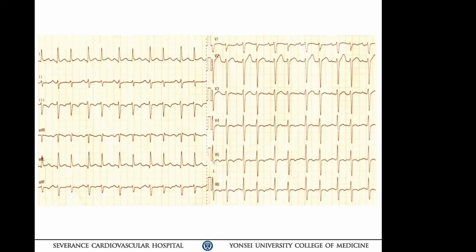They're not the same. Look at the precordial leads, for example, V4, V5. The first two beats compared to the second two beats, coupling is different, not the same. So you need to explain that first.